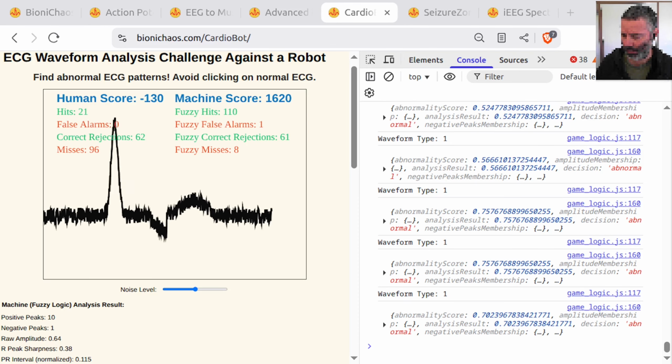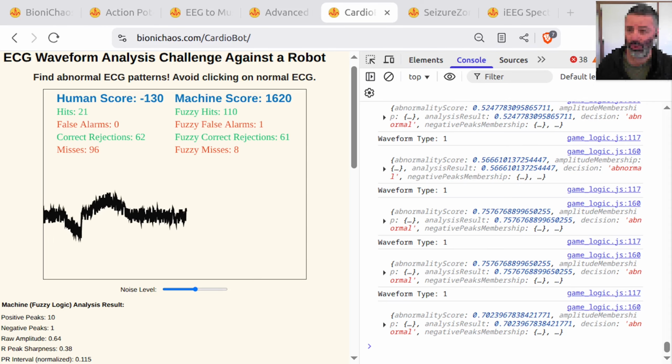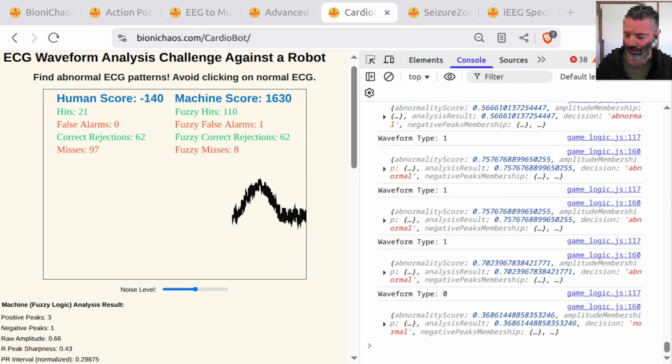Okay, wait a sec. So I'll do a quick overview of this tool.